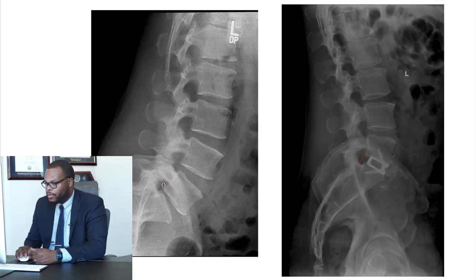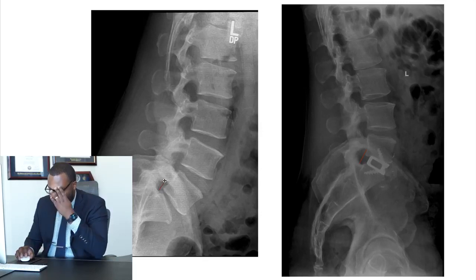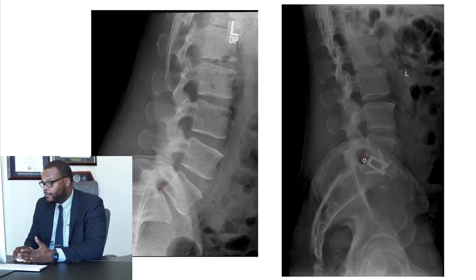You can see how narrow this foramen is, how much smaller as compared to the foramen here. So this nerve can get pinched, can cause some compression and some radiculopathy down the leg. You can see after a fusion, this actually increases this foraminal height, is what it's called. So that gives more space for that nerve. You can see we did this just with putting this cage in there to jack open this space, so the patient can have some relief of their pain just by indirectly decompressing this area, basically making more room for this nerve as compared to before surgery here.